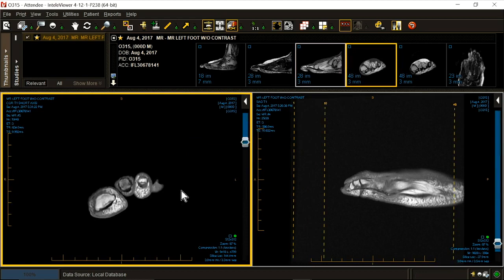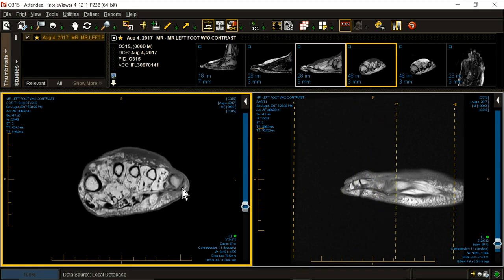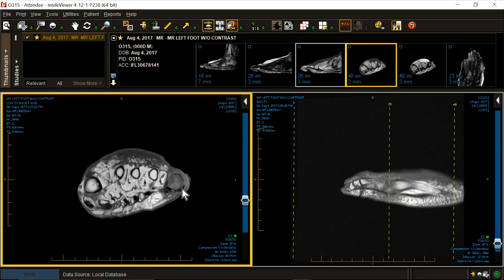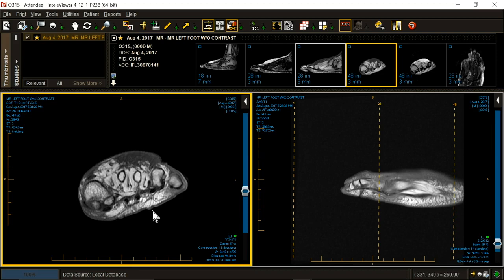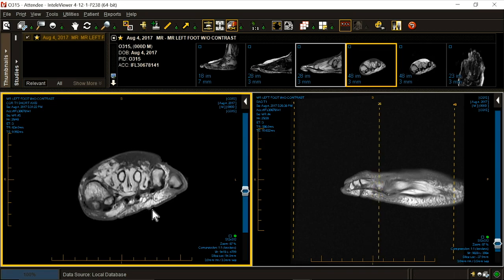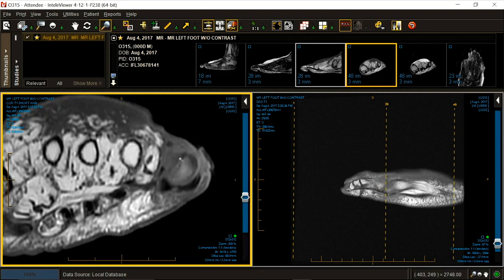It's a little tougher than the other cases. This one's tricky, but the answer's there. Osteo or no osteo? Yes, right there. Where'd the cortex go? Where did the cortex go? 3 for 3.